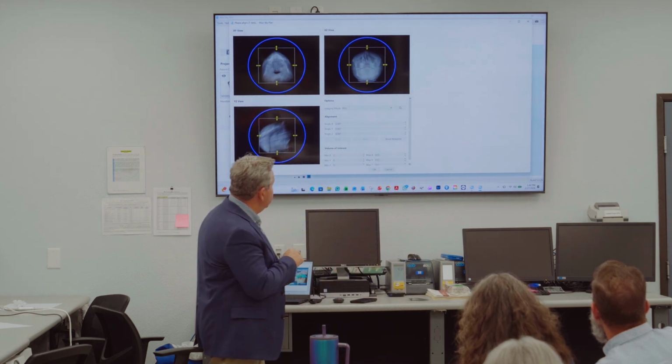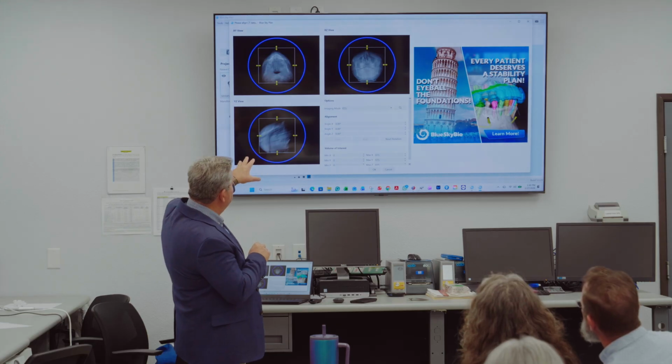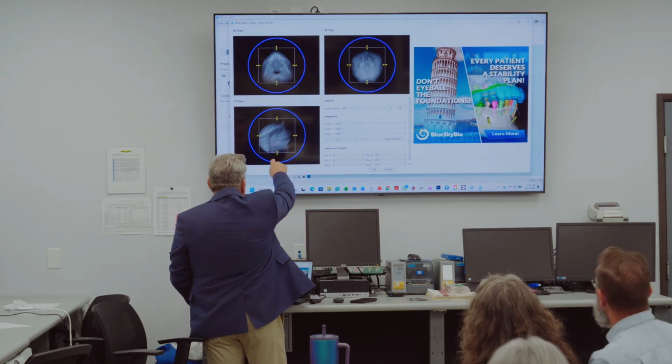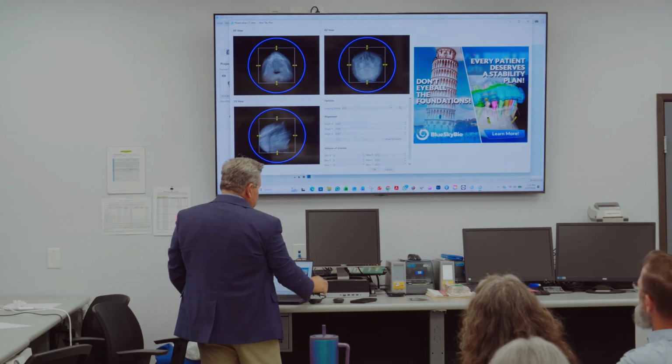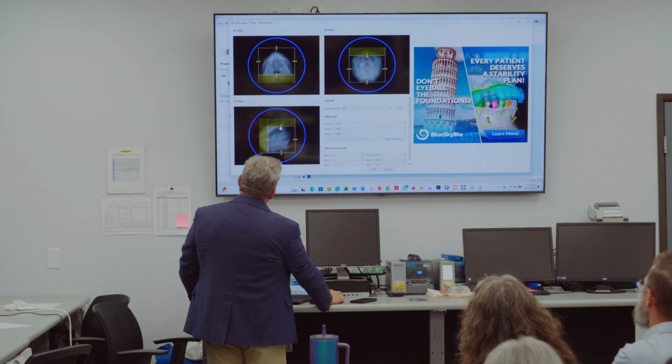This right here. So when you get to here, let's stop. This is how you adjust your file size. You're taking out a lot of noise that you don't need. This is a mandibular case, so we don't need all that maxillary data. We don't need all this cervical data here. So we could probably crop this in a little bit. We can get rid of this. Just go where the little finger starts, you pull it down. And this helps the computer work more efficiently.